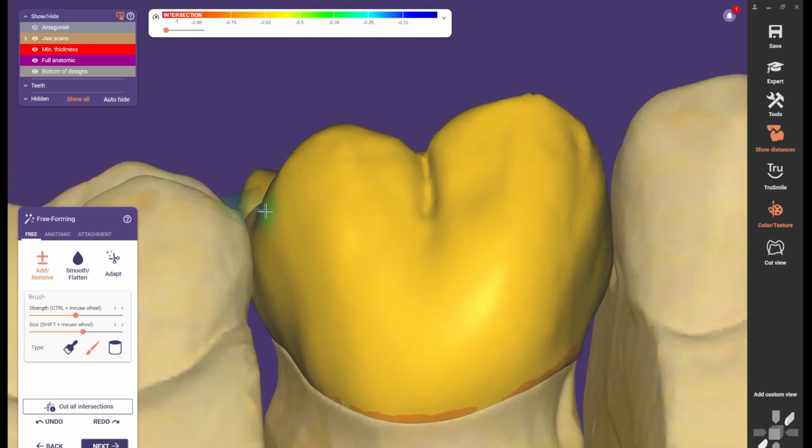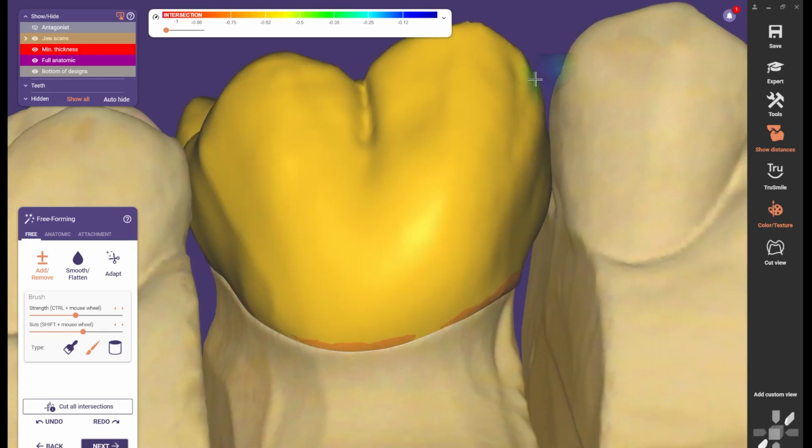Okay, let's give it some transition lines, which are always curvy. Then round it off after you did that. You don't want any sharp edges on a molar, or basically any tooth. Okay, take some of this bulk from here, smooth it off.